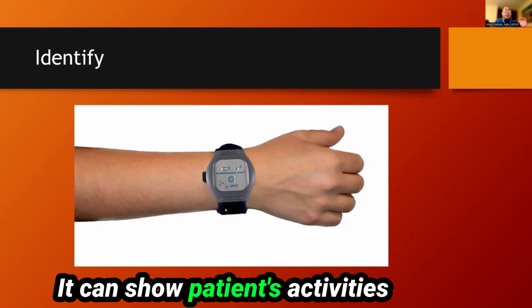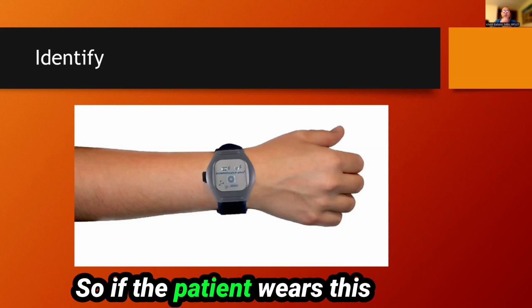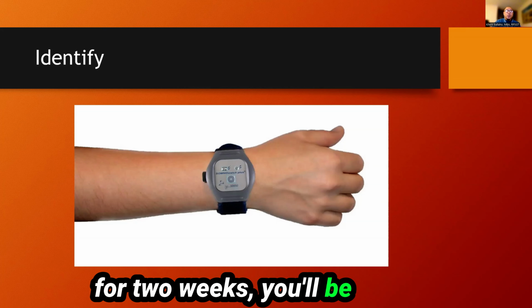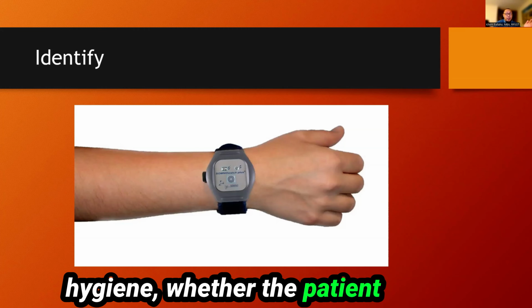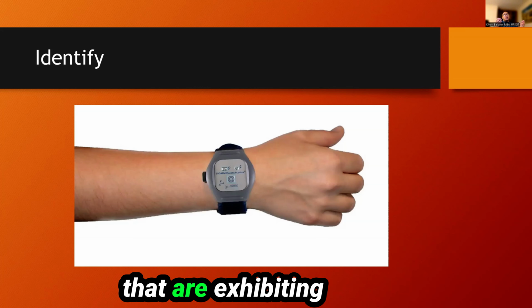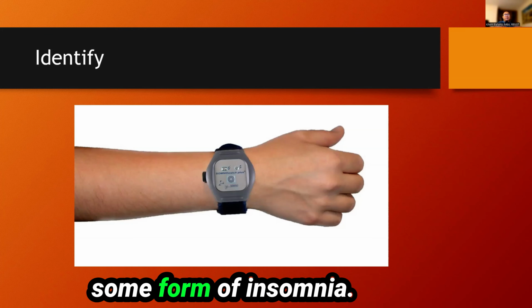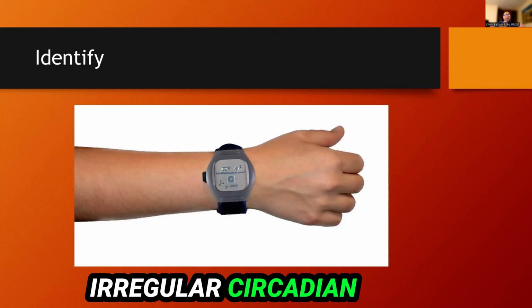It can show patients' activities throughout the day and night. So if the patient wears this for 2 weeks, you'll be able to identify whether the patient has a good sleep hygiene, whether the patient has a regular sleep pattern. In a sense, those patients that are exhibiting some form of insomnia, they might have irregular circadian rhythm pattern.